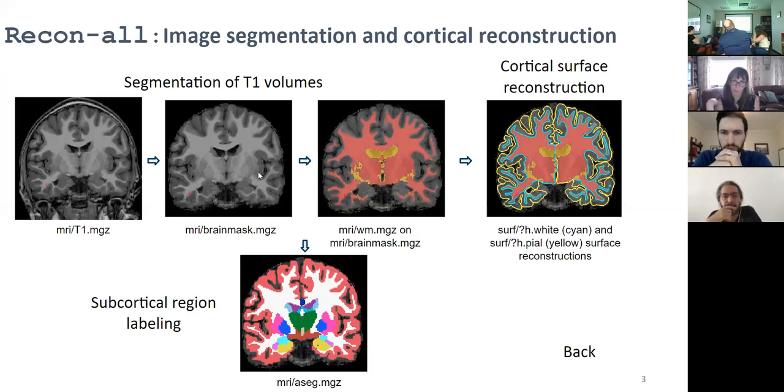I want to say that someone may have done some version of parcellating the thalamus a bit. I don't know how useful that is. But it certainly is possible for us to go in and parcellate these, semi-manually.